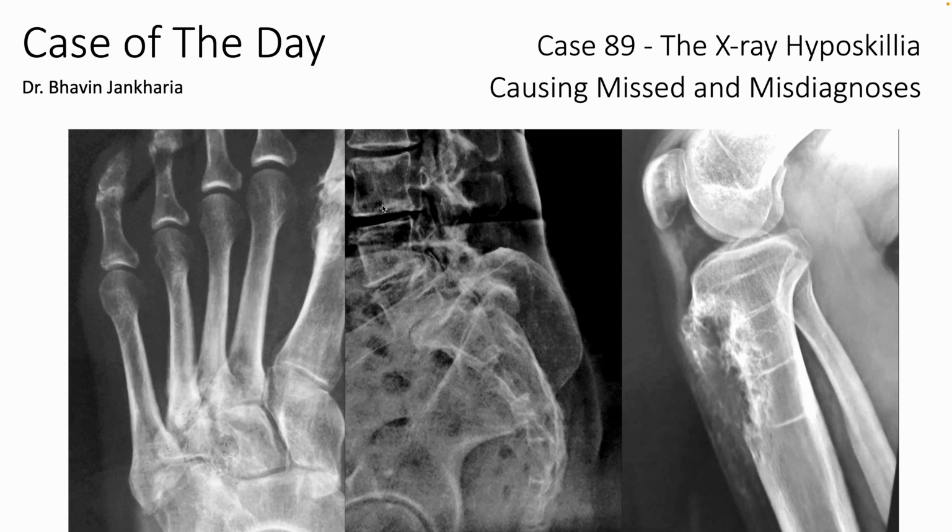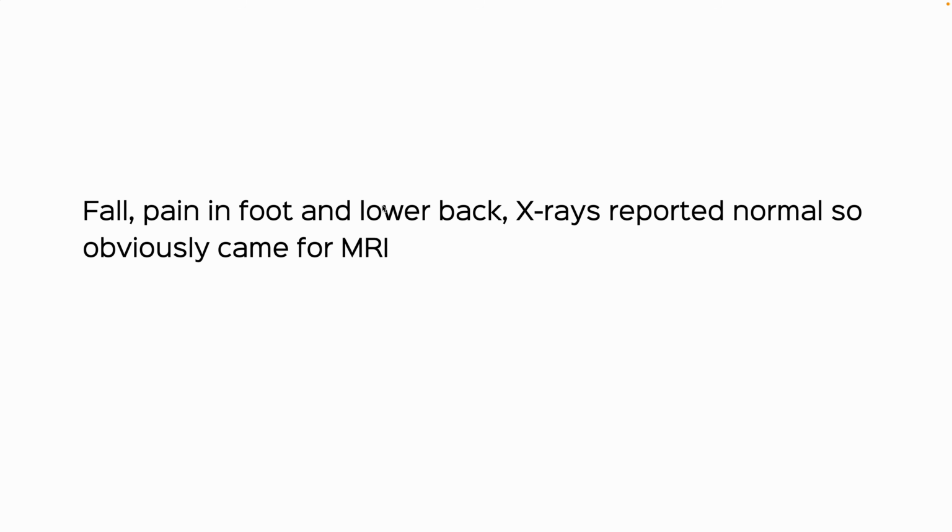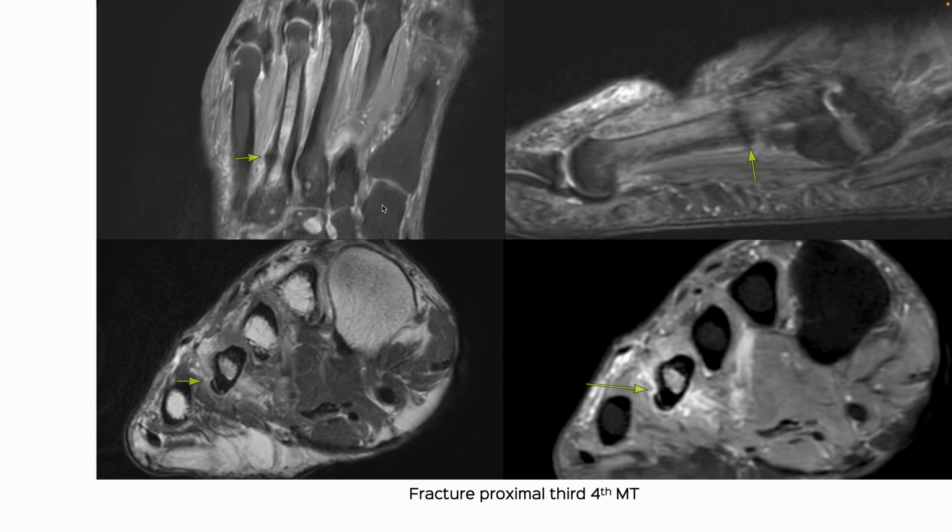All right. So, three situations, two different patients: fall, pain in foot, lower back, x rays reported normal, so came for MR. Because there was pain, the x rays were done 2 days before the MR. And the MR is very clear. There's a straightforward fracture of the proximal fourth metatarsal metaphysis. In fact, you can see the fracture along this cortex on the sagittal, marrow edema, periosseous edema.